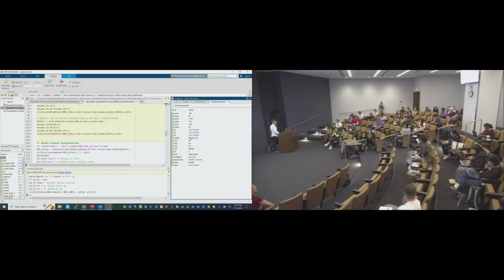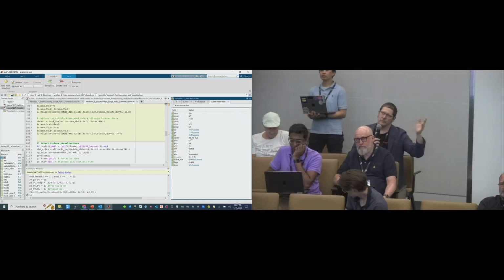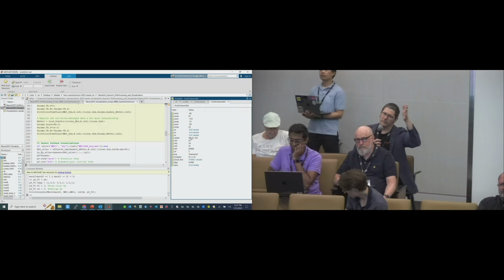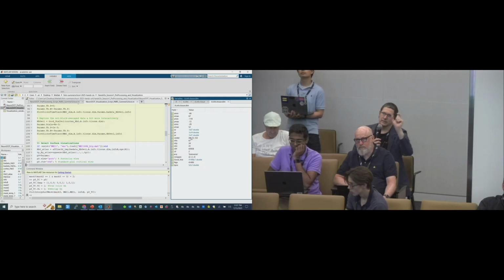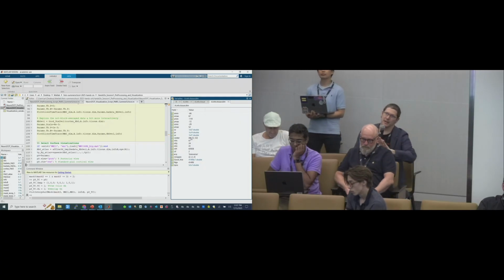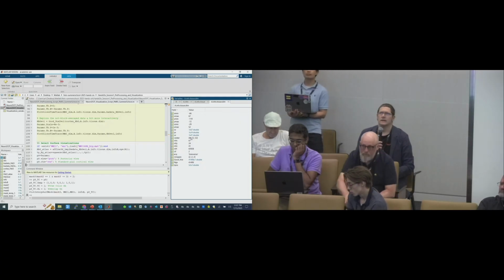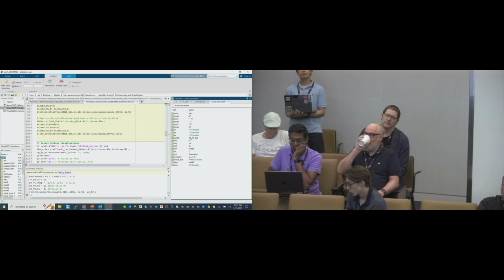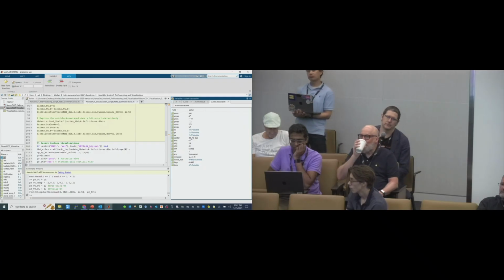It's just that the brick house of voxels is square and the cortex is a curved object inside of there. When you go from a volumetric view to a surface view, all you're doing is interpolating from the rectangular cubic bricks onto the little tetrahedra or triangles that make those surface meshes. So there's no projection in a back-projection sort of way. Nothing moves in space. It's just reinterpolating onto the cortex. It's all in the same space.